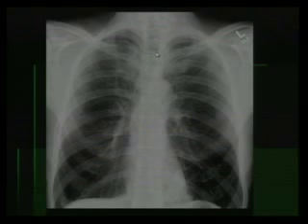See if the trachea is being displaced. Look up at the lung apices for Pancoast tumors. Look over here in the shoulders to see if there's some bone tumor. Look in the hilar regions, parahilar regions. Look through the diaphragm and the upper abdomen. Look behind the heart. And if you look behind the heart, you see that there's definitely a consolidation. There's an opacity here in the left lower lobe.